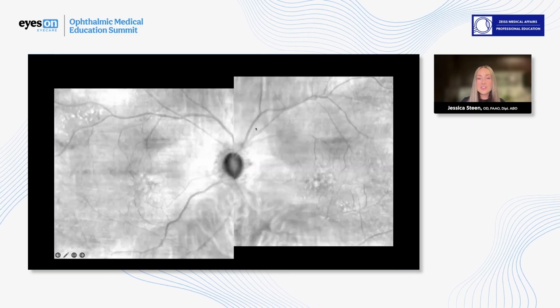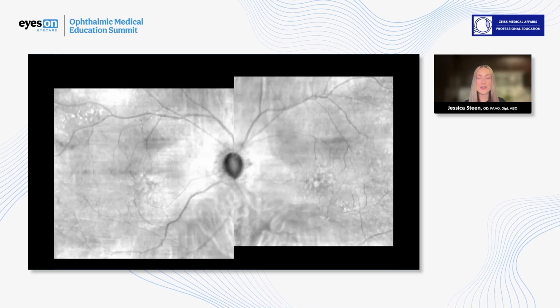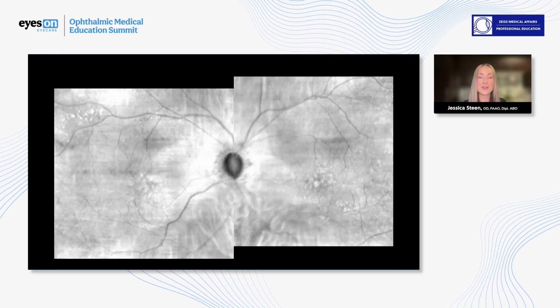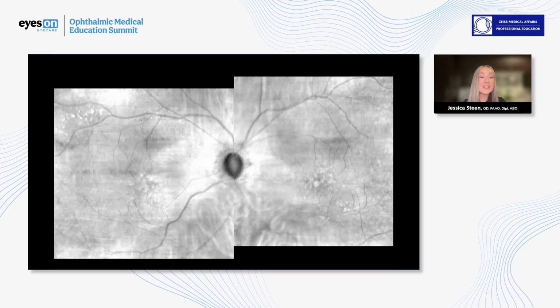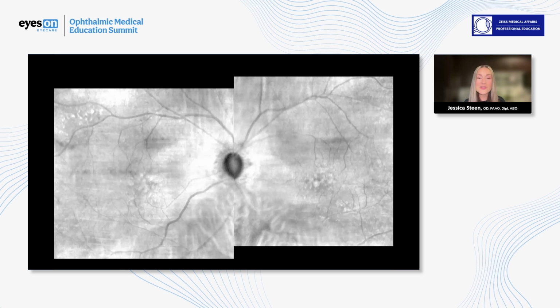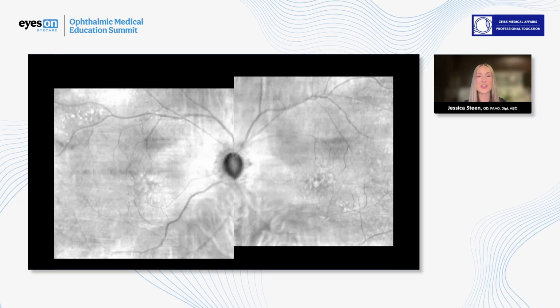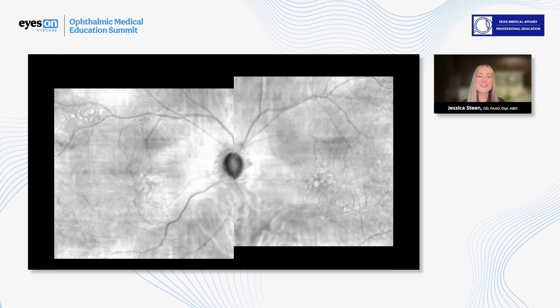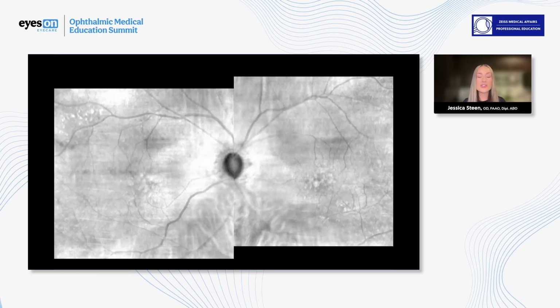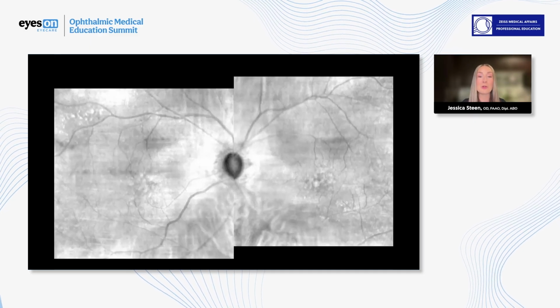change. Now, I do like to utilize the infrared reflectance imaging, especially in age-related macular degeneration. What we see is a greater extent of drusen than what we were able to determine with color fundus photography alone. When we look at the right eye, we clearly see an area of drusen in the superior temporal arcade, and in the left eye, drusen that extends inferior temporal through the temporal aspect of the retina into the superior temporal arcade. Even looking at the center of the fovea, we can see with infrared reflectance imaging that the area of drusen that's present appears to be much greater than what we could determine with color fundus photography alone.